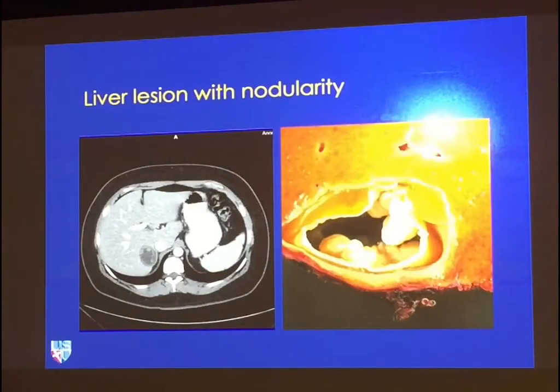Here is another example, a cystic lesion. This time, we have many enhancing peripheral nodules. Whenever a radiologist sees a cystic lesion that has solid components, you're definitely thinking neoplasm, although infection is in the differential. So this is something we would need your help to make the diagnosis, not something we'd be sure of.